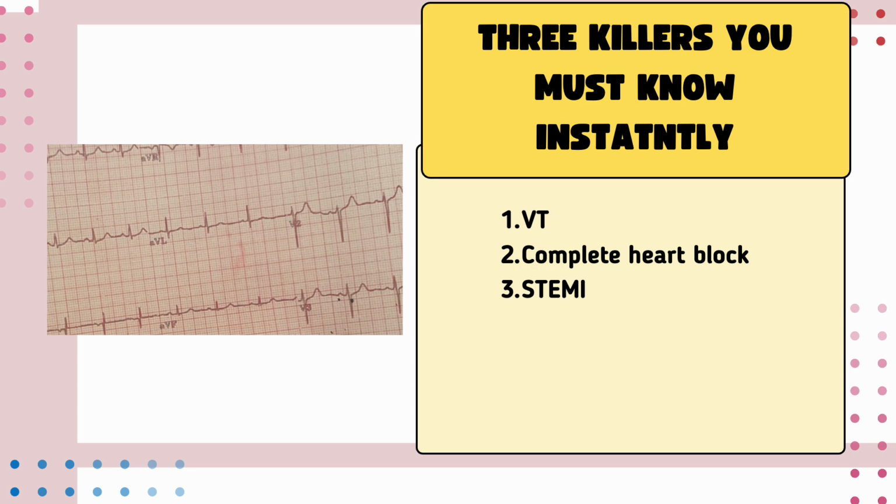That is the ventricular tachycardia, which I just described. If the QRS is wide complex and the heart rate is high, above 100, you're dealing with a ventricular tachycardia. It's not like you're checking for these things afresh. If you've had these three things in mind from the moment you started with your rate, your reading, your axis, your intervals, you're already putting these together.